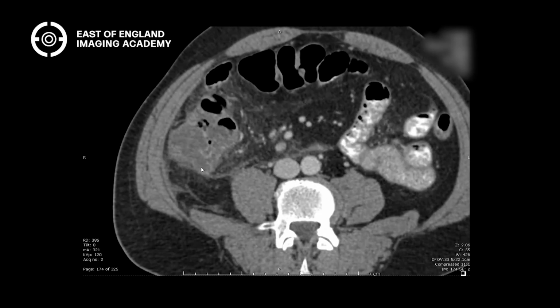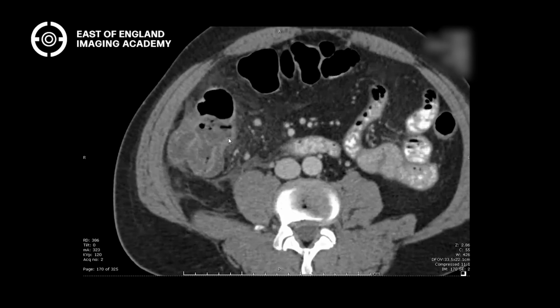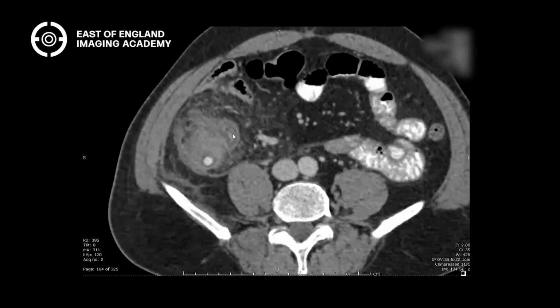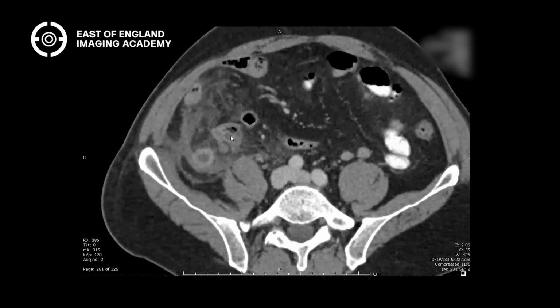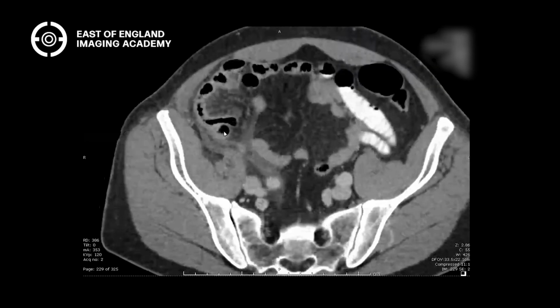Thickened, yeah, exactly. So here you can see that's the serosal surface. This is the enhancing mucosa, and then you've got this really edematous wall. Look how thick that wall is, really, really thick and edematous, right? Here you come down, and you can actually see this is the terminal ileum coming out of the colon, which also appears a bit thick-walled, doesn't it? You can measure the wall that's quite thickened there, right? You can then follow the terminal ileum and prove it's not appendix because it continues on and joins other small bowel loops, etc.